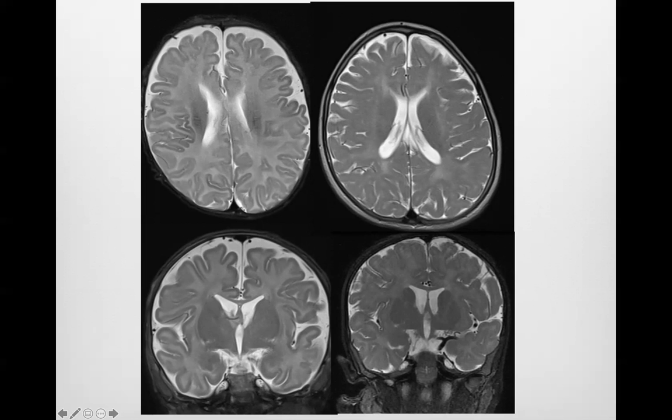The myelination should be completed by 2 years old in T2 weighted signal, but in this case, this patient is 4 weeks old, so it's fine, almost completely unmyelinated brain. This other patient is 2 years old and did not have any myelination, and this is a hypomyelinating pattern. So not only what we see is important, but also the timing.